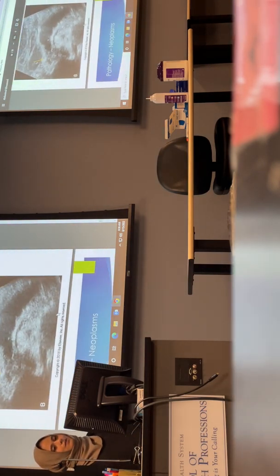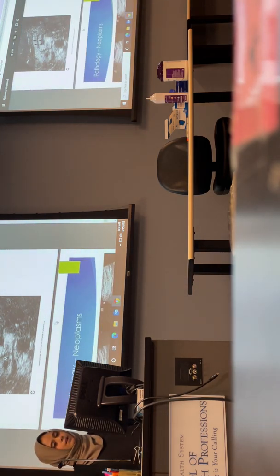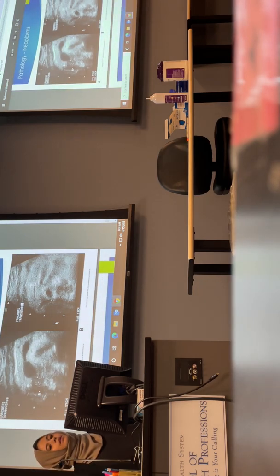The rest of all of these are just, if I were to give you any of these images, they're essentially just looking at sonographically describing them more than anything else.